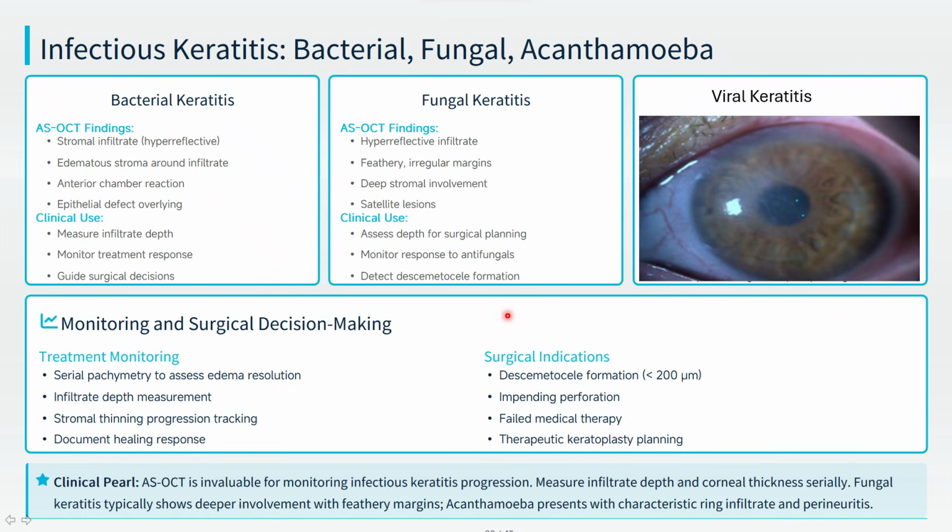on. So this is very important, especially in cases of polymicrobial keratitis, where you don't know whether your patient is improving with your treatment or not, because sometimes you have a combination of bacterial and fungal keratitis. So you start antibiotics and you see partial improvement, and then the patient is not improving. So the monitoring and follow-up of the case with the OCT is very important.